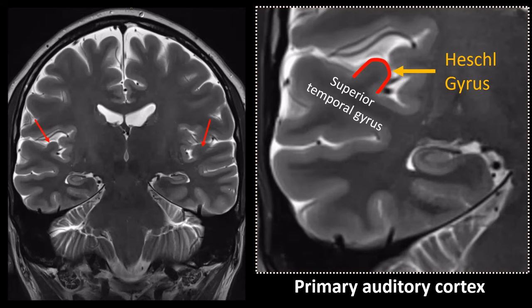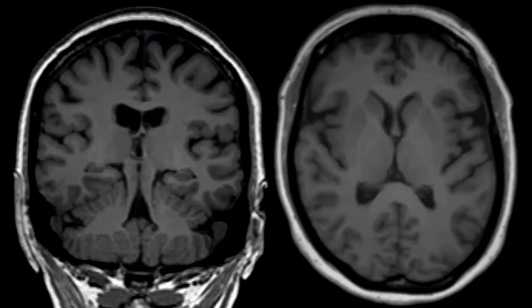And we have, self-evidently, a Heschl gyrus on both sides. Now, the Heschl gyrus is easily recognizable in the coronal plane. Just look for a knob that looks a bit like a mushroom on coronal images, but you can also see it in axial planes, especially if your images are perfectly symmetric at the level of the thalami, often at the level of the interthalamic adhesion.